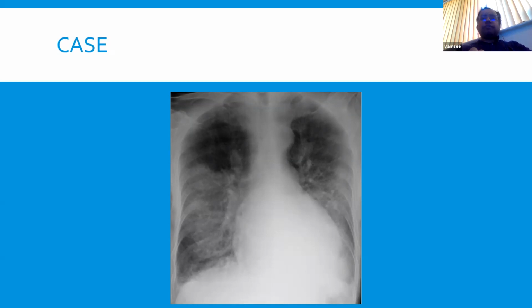Seems to be rather busy. Yes, precisely, Andrew. It might be a pericardial effusion, that is true, or it might just be an enlarged heart. It's pretty hard to say on an X-ray, but the main thing I wanted people's attention drawn to is that this is a classic picture of heart failure.